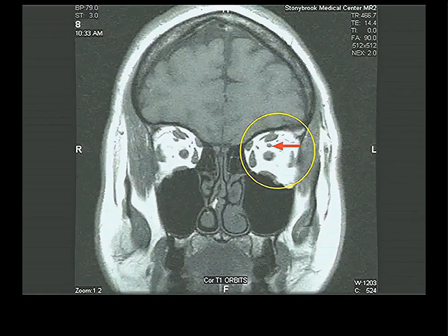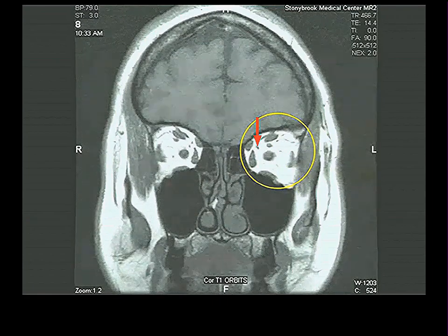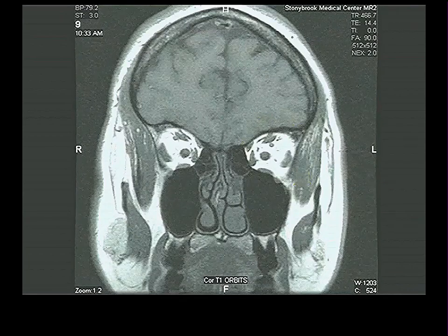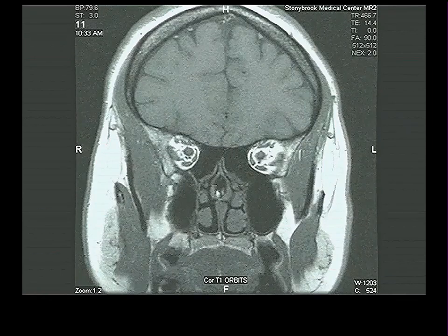We see two vascular structures that I feel I can identify. One which sits on the inferior surface of the superior rectus, superior ophthalmic vein. One which sits more medially. After it's crossed the optic nerve, it will run along the upper edge of medial rectus, and there's the ophthalmic artery, which runs along the upper edge of medial rectus to get to where it's going. So you can see lots of stuff. Going backwards, backwards, and they're all converging.